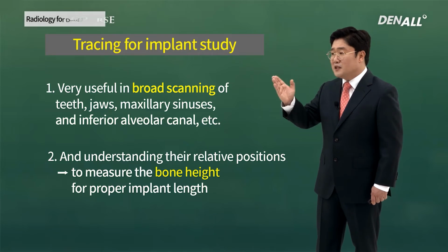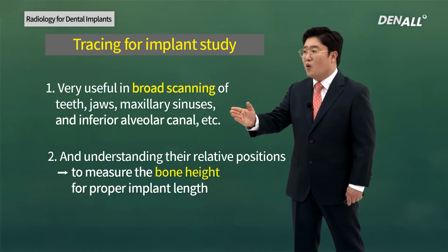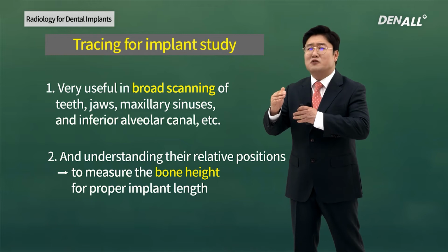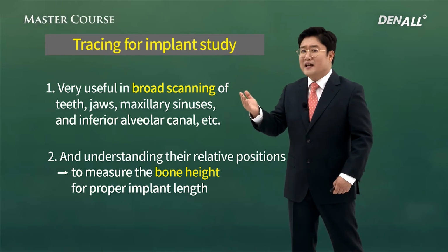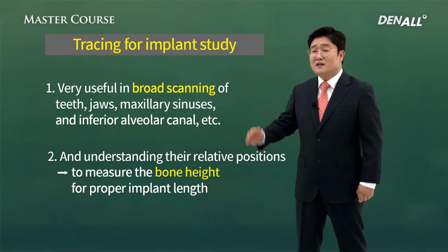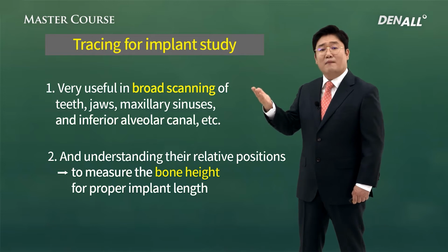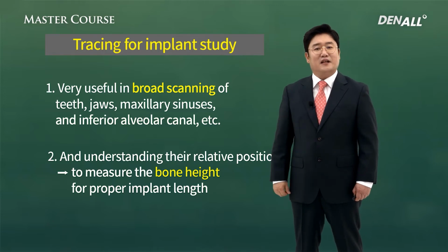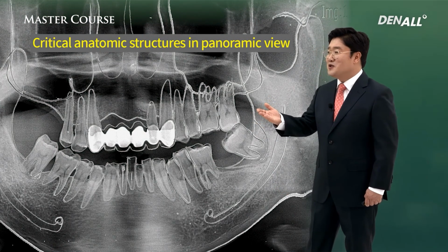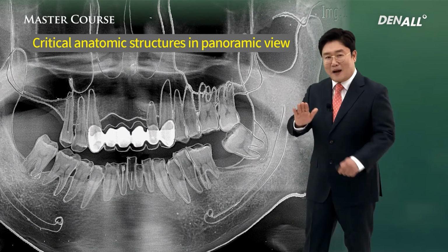And more importantly, through the panorama pictures, the bone height where implants would be placed later could be identified. That was the big purpose of using the tracing. Panorama X-ray or panorama radiology. Over that, tracing was done. This was an implant patient.